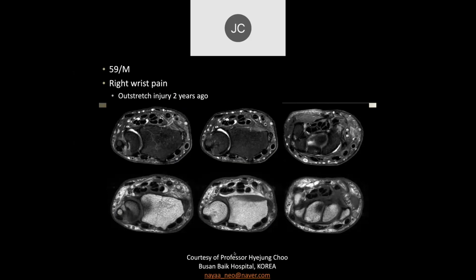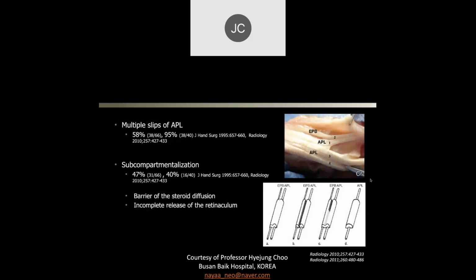All right. Let's see. And the area of concern is actually over here. Okay. Looks like we definitely have tendinosis of the first extensor compartment. Not any significant fluid in there though. Okay, so I would agree with you there.